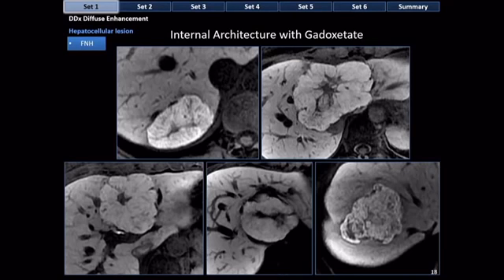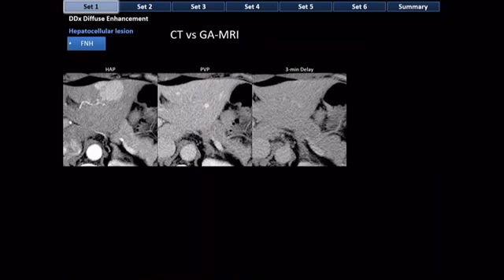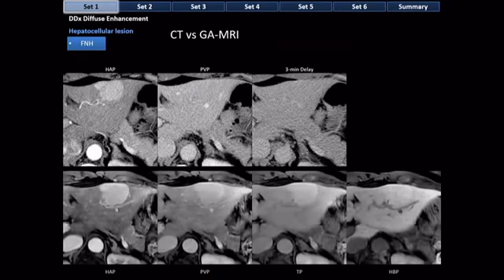When you see a central scar and this radiating network of fibrous bands, you can come down very hard on FNH. Now, this is a case very similar to the one I started with, a lesion that hyperenhances and virtually disappears. I mentioned earlier that you can't unequivocally make the diagnosis of FNH in a case like this. This is a CT, but you can always bring the patient back for MRI with a hepatobiliary agent. And if you look on the image on your right in the hepatobiliary phase, this lesion is retaining the agent and is very likely to be an FNH.